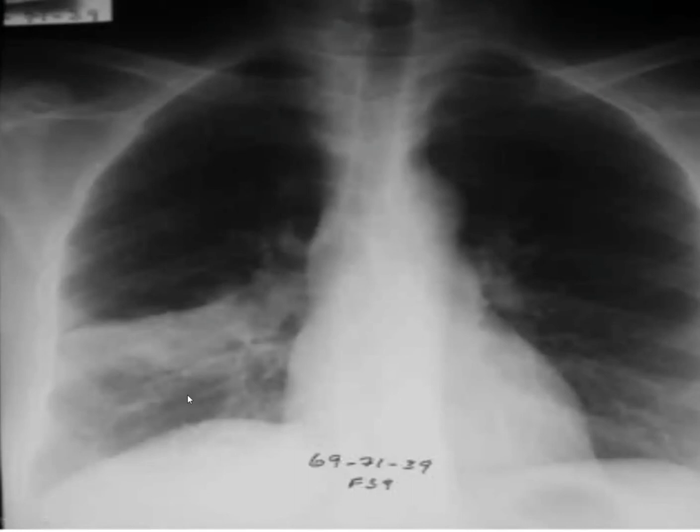One thing we need to take note of is, are you able to see the homogeneous opacifications? Yes, so immediately you can already start thinking of pneumonia. And you're able to see the affected lobe has still retained its volume. This is why I said that in children sometimes you may see a rounded mass maybe here, which a person might start suspecting is cancer, but it's not. That's how sometimes it may present in children. Then it often shows air bronchograms. In this image it's not so clear, but I'll show you in the next image.